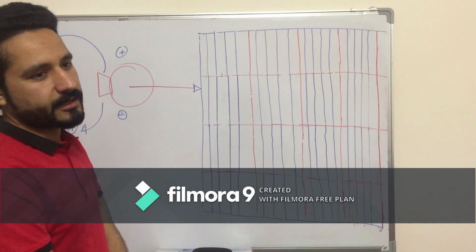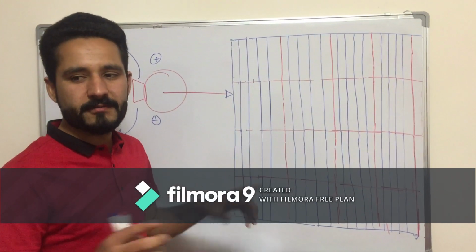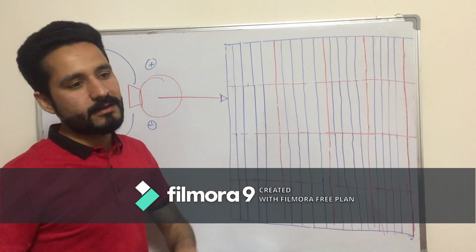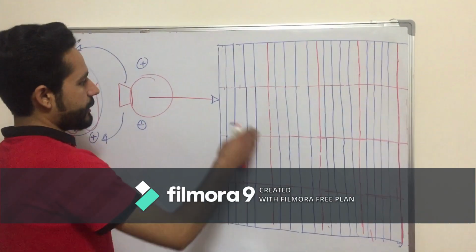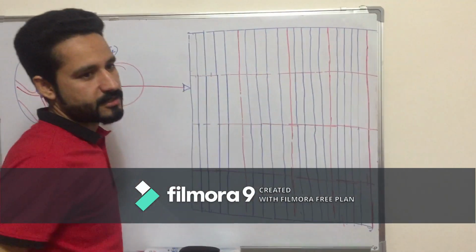As we have already studied different types of electrical impulses, and because of these impulses we have drawn different vectors, and because of these vectors we have drawn a normal ECG. Now suppose this is ECG paper, with special lines made particularly for the ECG.